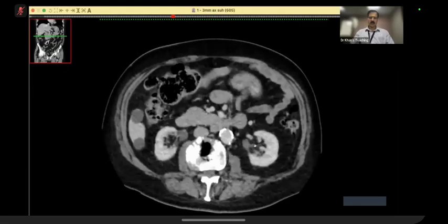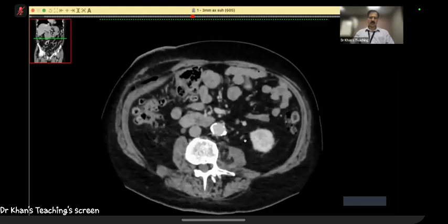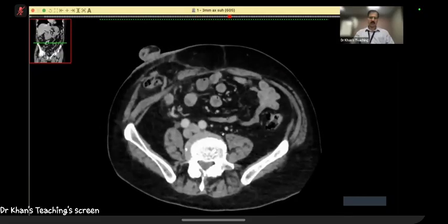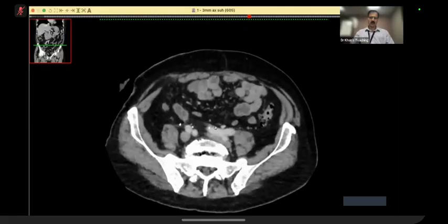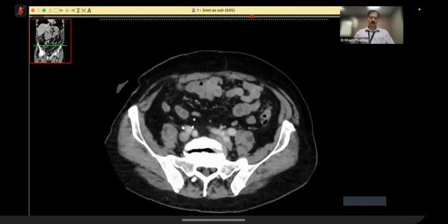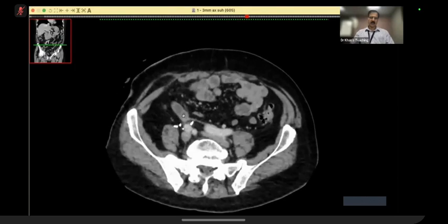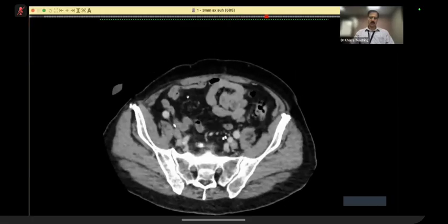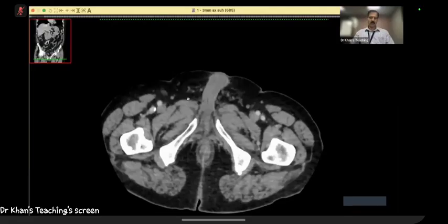Other side. Now, this is the left ureter. And it is collapsed here, and then it crosses the midline. Here you are. This thin line is it, and it goes into this loop here. And ultimately, of course, this loop continues out. So this is the ileal conduit.